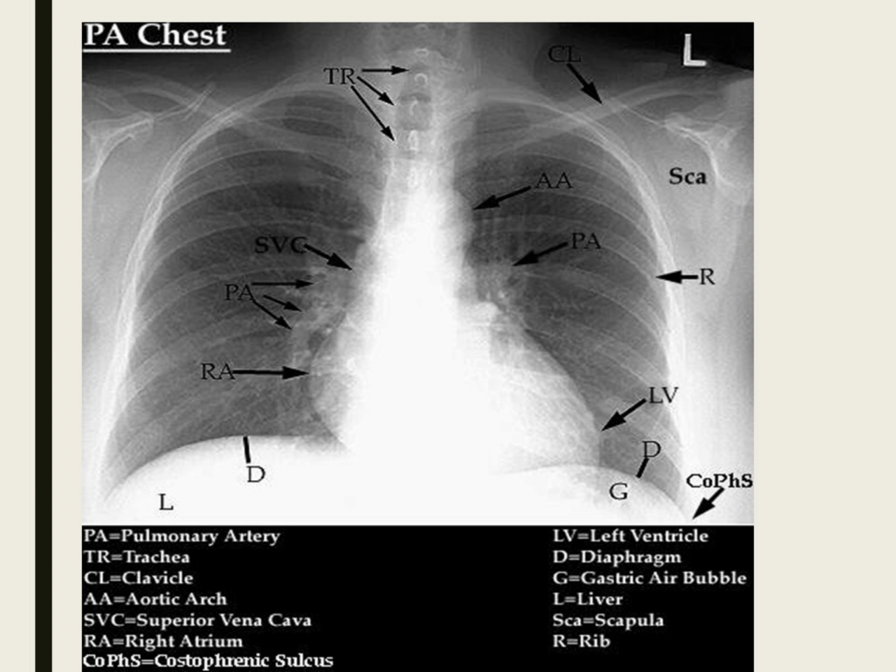You look at the clavicles and the vertebra, usually nothing exciting, but I've missed things. Looking at somebody's chest X-ray, there was a broken clavicle. I remember that because I was looking at the chest, not the arm. Interesting: if you don't look for it, you'll miss it, pretty much.